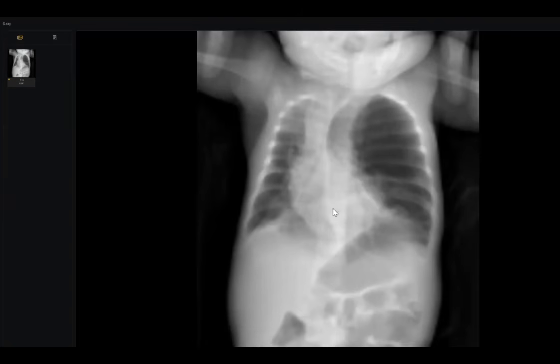Okay. So this is the whole left lung. Part of it is hyperinflated, part of it compressed and looks a little bit collapsed. So the pathology is here. This is a lobar, congenital lobar emphysema. Number 2, why is this not right-sided hypoplasia, aplasia, something like this? Number 1, because the hilum is normal. Vessels look normal. Number 2, not all the lung is hyperinflated, just one lobe.